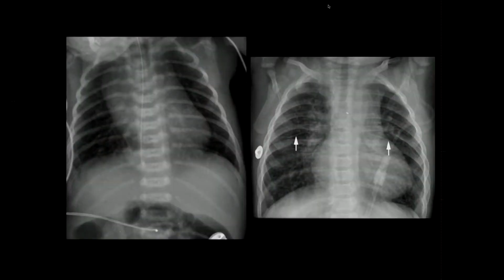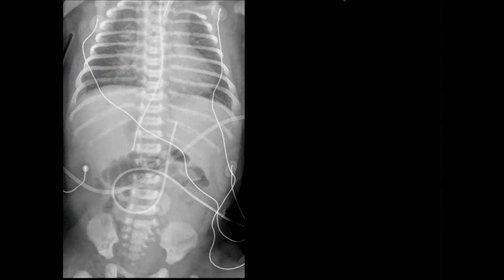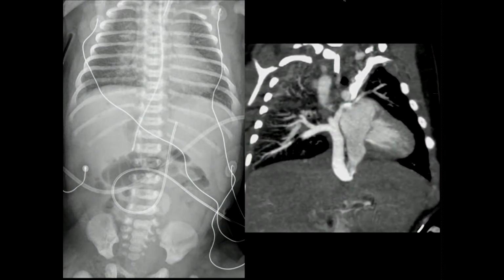Okay, so here are examples. Completely transverse liver, again. So here are minor fissures on both sides. So this is right isomerism, period. This is another case that we experienced a few weeks ago. The bat wing-like transverse liver, a very medially located stomach on the right side, and a reticular pattern here. Right isomerism with the infracardiac type of TAPVC.